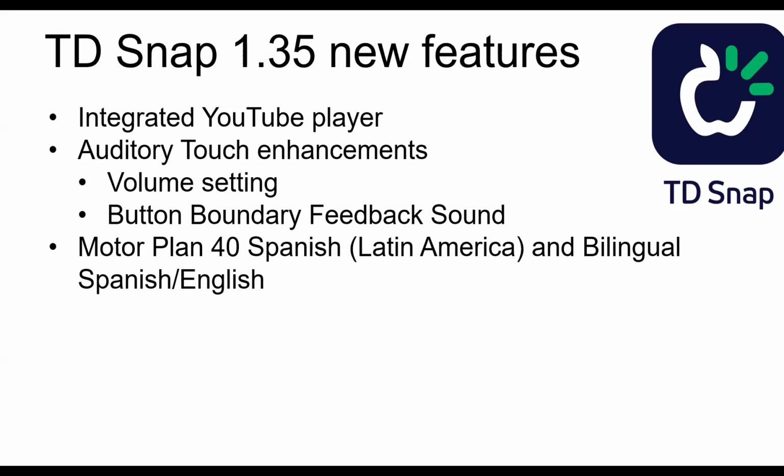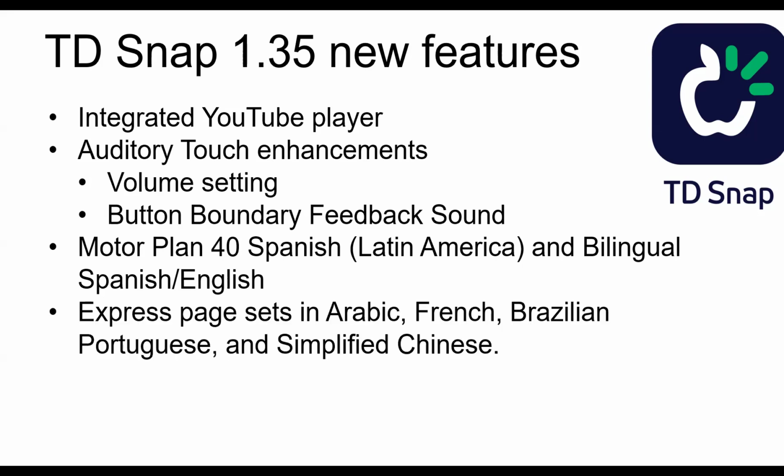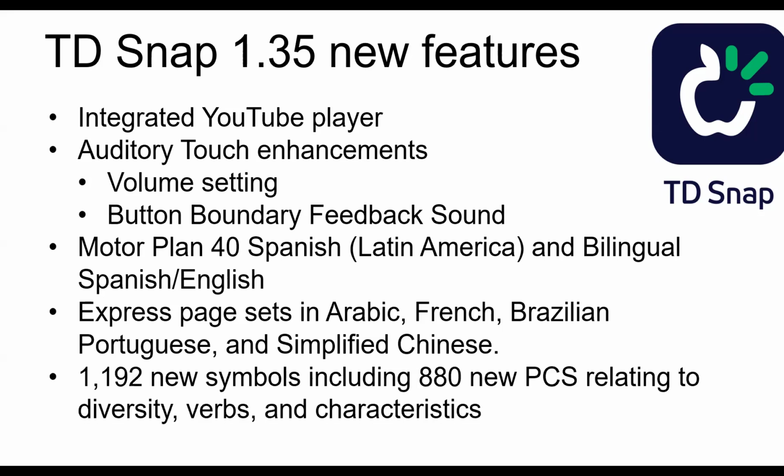We do have additions to our page sets as well. The Motorplan 40 page set has been released in Spanish and also bilingual Spanish English. And the TD Snap Express page set has had new languages added, including Arabic, French, Brazilian Portuguese, and simplified Chinese.